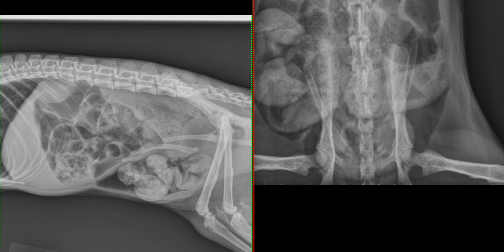So, in conclusion for this patient, we have an opossum carrying 4 joeys or juveniles. We have loss of serosal contrast and moderate generalized gas distension of the intestine. The generalized gas distension of the intestine is likely due to the anesthesia required in order to obtain these images and would be consistent with a functional ileus.